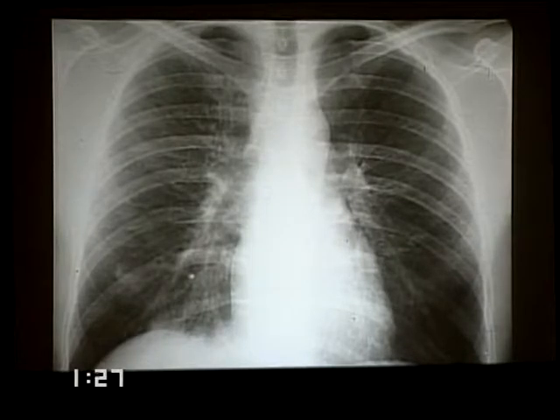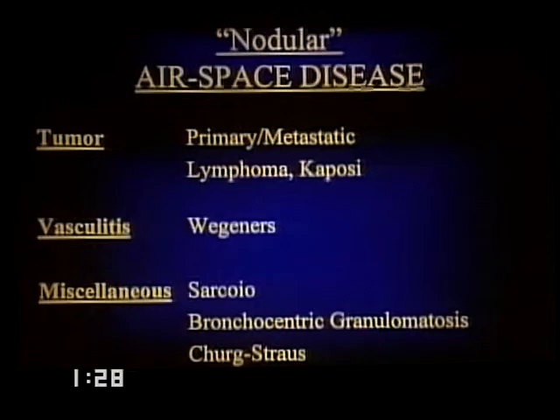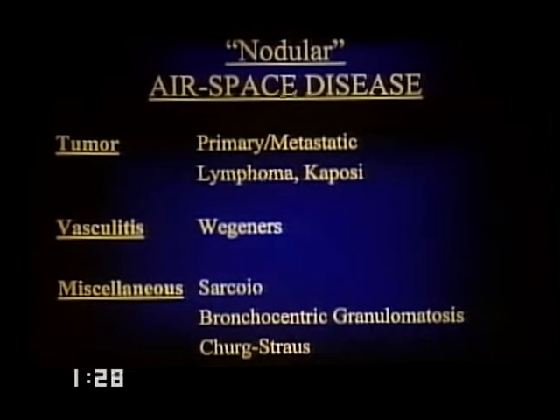Radiologically, we can only differentiate between sterile and infected aspirate when a cavity forms. Sometimes the presence of an adjacent pleural effusion will be a clue that we are not dealing with a sterile aspirate. Another example where both posterior basal segments are opacified, beginning to involve the lateral basal, obviously clearly posterior because the heart margin is preserved. These actually are both, so far, sterile aspirates. They contain innumerable bacteria which have not yet taken.